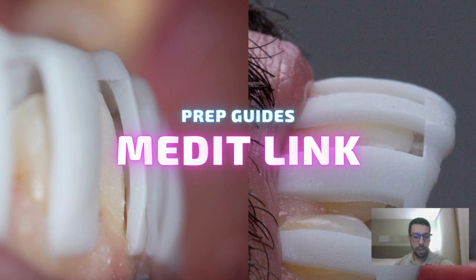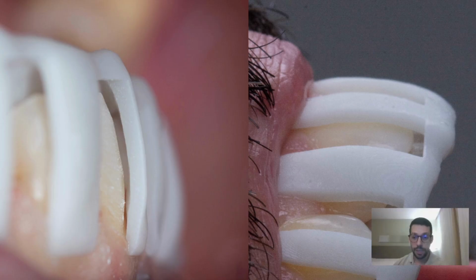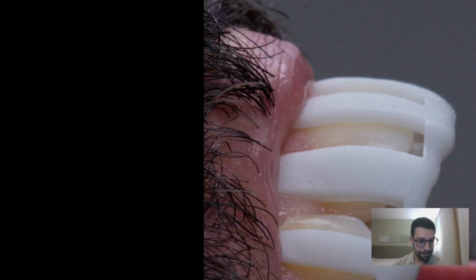Hello guys, today I'm gonna show you how to design these kinds of preparation guides. This is a philosophy from DSD team and Christian Coachman, and I'm gonna show you how to do it with Medit Link, and in this case with Medit Design and Medit Splints apps. It's a very good guide to show you how much amount of space you have for your restoration material, and so let's do it.